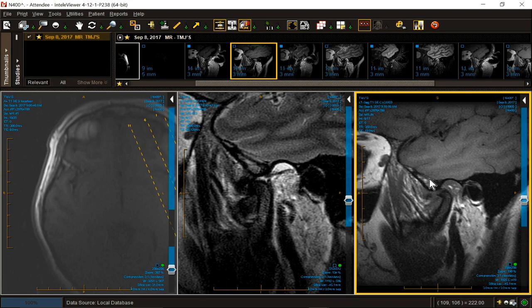Number next, mild condylar translation indicating mild ability to open the mouth. Meniscus torn at the junction between the attachments and the meniscus itself. Associated arthropathic effusion, predominantly in the superior compartment.